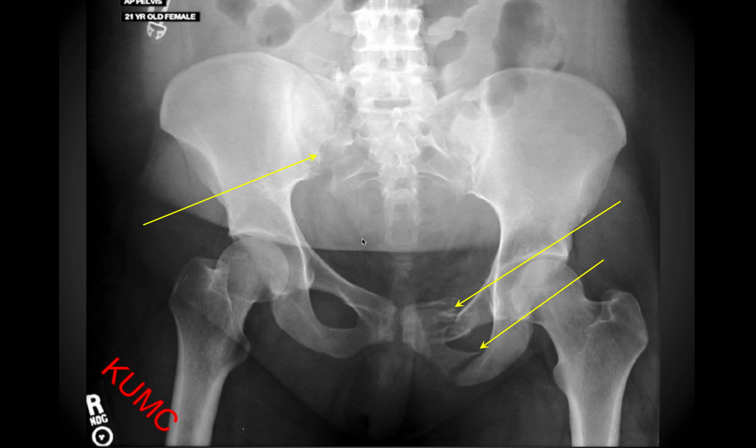And then typically, if there's a fracture somewhere in the pelvis on one side, there's oftentimes going to be a defect on the other, on the contralateral side as well. And so that's what we see over here, a disruption of the SI joint, contralateral and posterior to the location of the pelvic fracture down here. So again, that's a pretty common pattern.